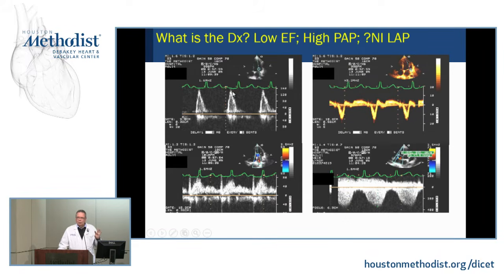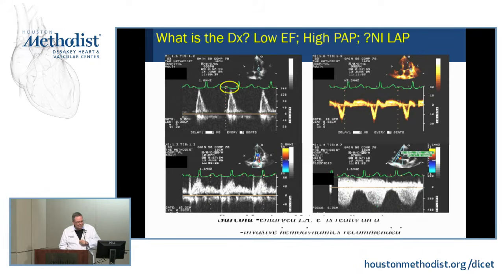What should that make us think? Anyone? Sarcoid, correct. So again, there's nothing here that comes out saying sarcoid, sarcoid. Now, if you know the patient also has pulmonary sarcoid, then you're in great shape, okay?